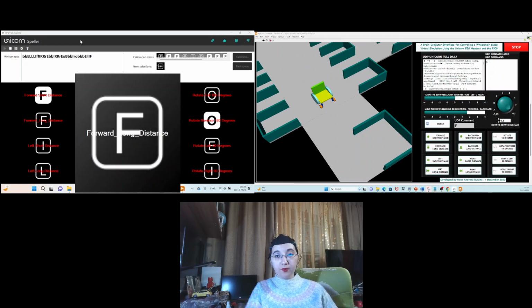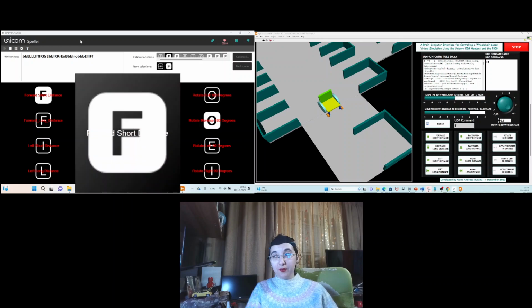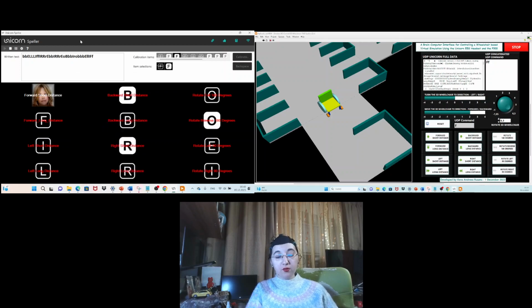Yes, perfect. Then forward short distance 2 times. Yeah, perfect. I'll continue with the same command, forward short distance.